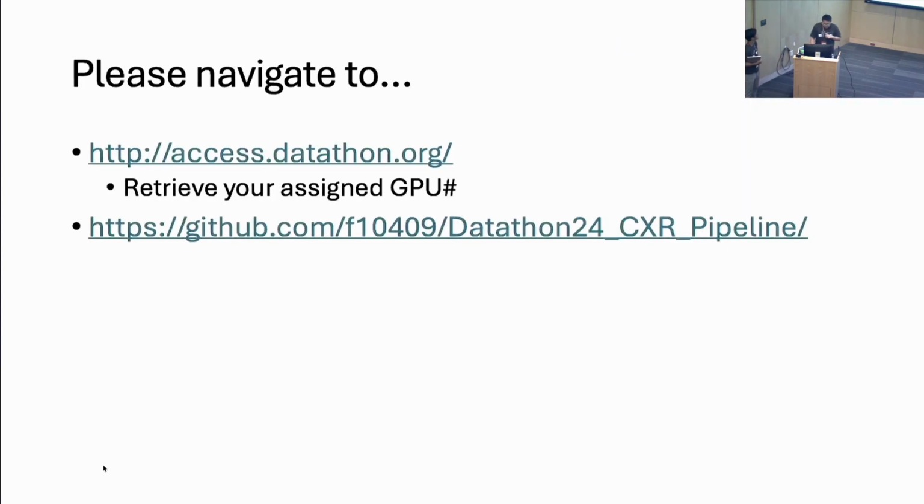So first thing, we need to navigate to these 2 links first. Everyone, please go to the first link to make sure you know your assigned GPU number. It's very important. If you mess it up, you'll crash others' programs. So just make sure you have your GPU number.